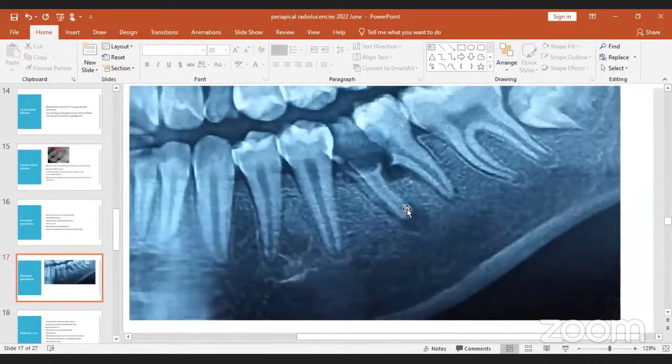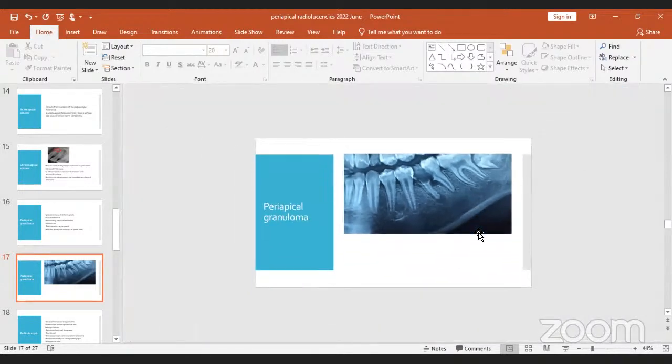And what's also happening is there's resorption of the root in that area. Looking at the 7, it is still developing. So what you see at the apices of the 7, these are open apices. The tooth is still forming, and that is normal. Other radiolucent areas that you find in bone would be like the bone marrow. So that is normal. It's not pathological.